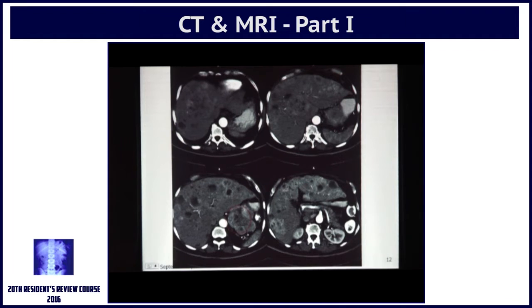A dual phase case for a patient who has metastatic carcinoid. That's the carcinoid in the region of the pancreatic tail. These are arterial phase images, and just for a little tip that I have seen, it's not documented anywhere in the literature, and I'll show you examples of that. You can see that the metastatic disease in this patient is hypervascular.